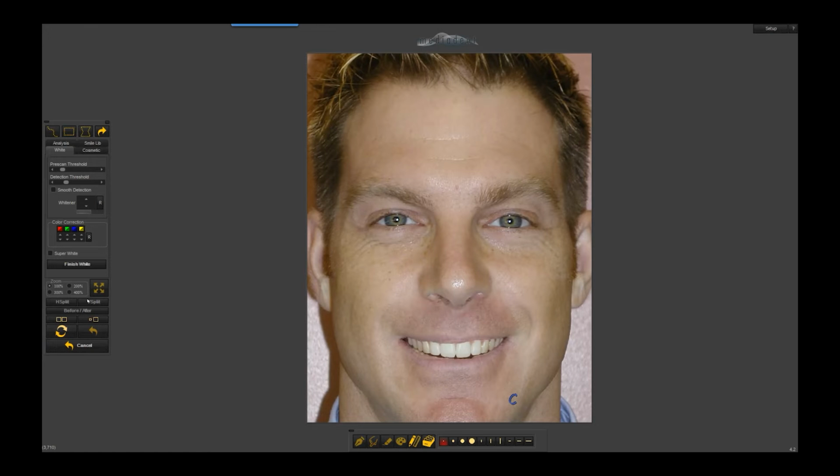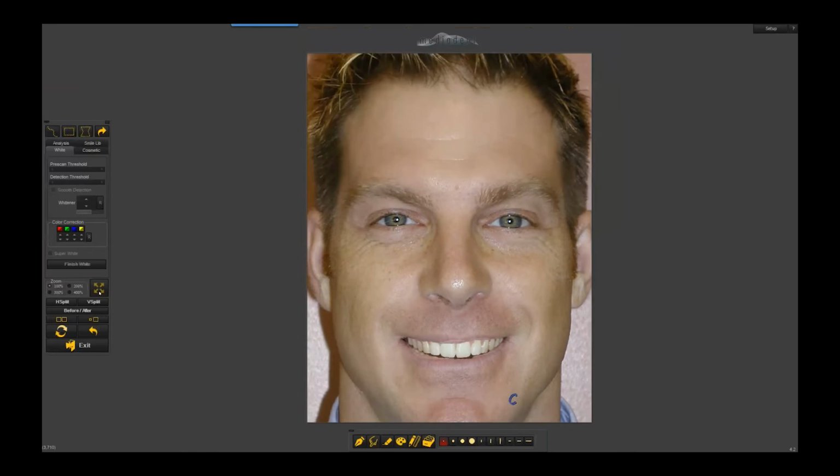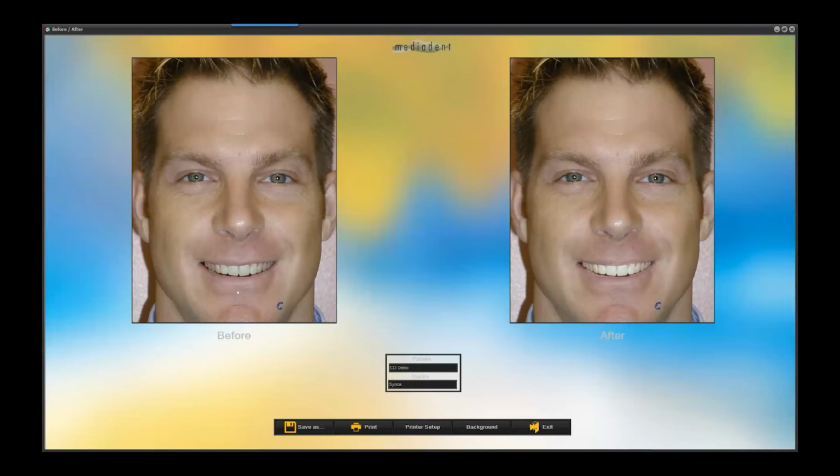But you can see he just went through and quickly whitened the teeth and got them to a natural looking shade color. It's just very quick. Everything in DDS is pretty much done with one button. With other softwares, you click a button and a drop down menu opens up. Or if you want to see a bite wing series, you click on it and a whole menu opens up, and you have to pick the right date. Our product pretty much is done with a single press of a button.